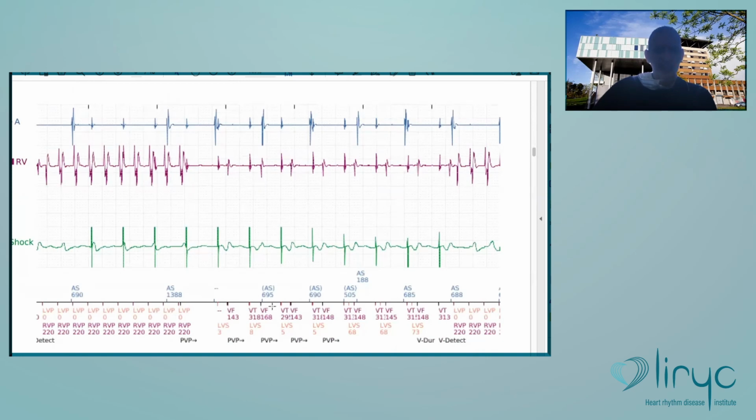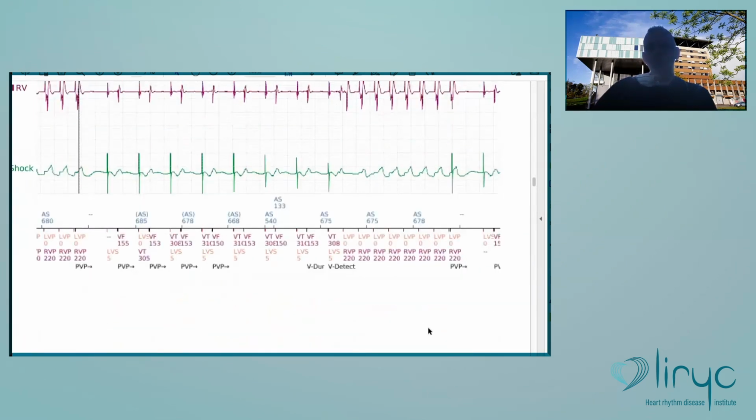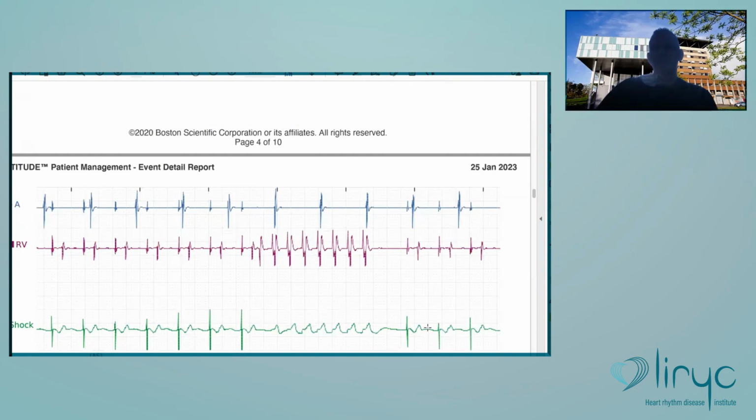Okay, then reconfirmation. Redetection 1, 2, 3, 4, 5, 6, 7, 8. So 8 out of 10, 1 second duration, and then a new therapy. And luckily, most of the time, the runs of pacing are between 10 to 30 seconds. You see, you pace rapidly to decrease the cardiac output to facilitate the implantation of the valve.